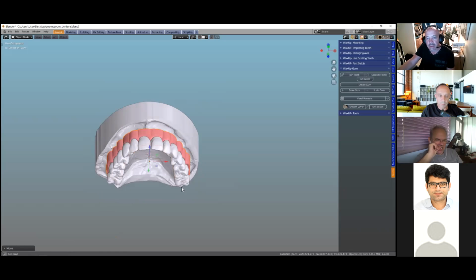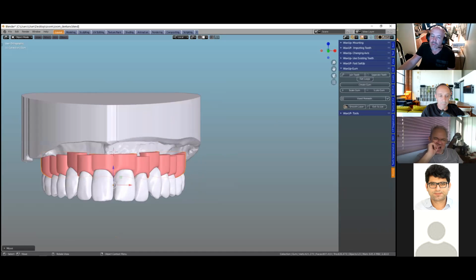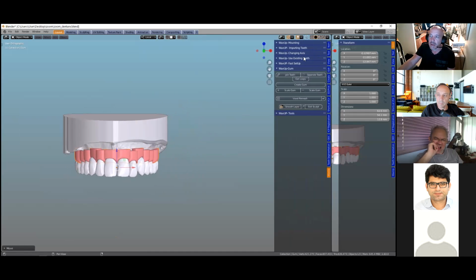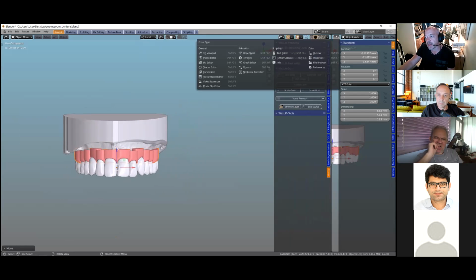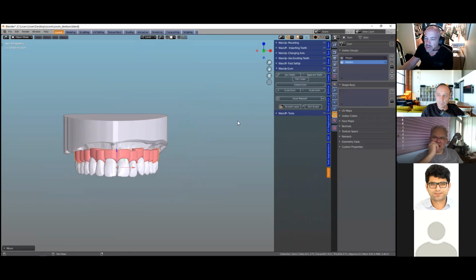And that creates tissue. Now, of course, this tissue, we want to connect nicely with the model. And so what I'll do is, okay, this has not been 100% structured on the menu, but you guys can just see basically what I'm doing.